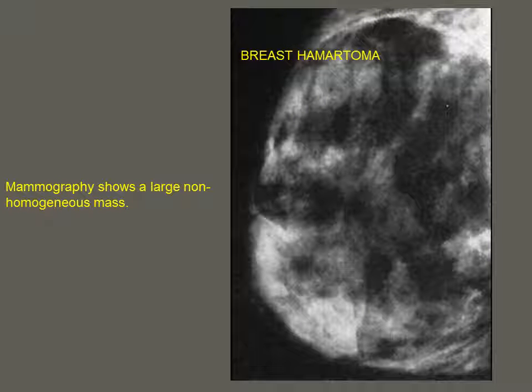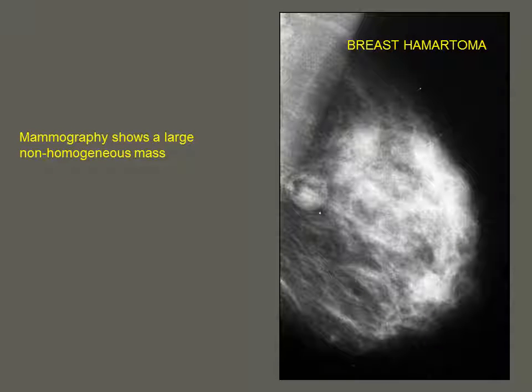This is breast hamartoma. Another case, a large non-homogeneous mass, as we see, with pseudocapsule, breast within breast, same looking, same view, same textures as breast tissue. Another large non-homogeneous mass of breast hamartoma.